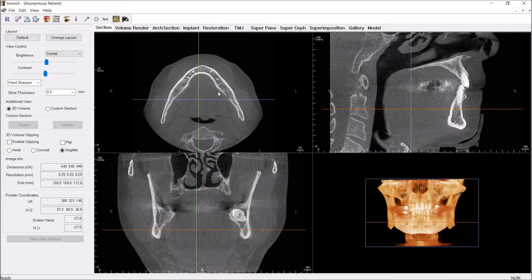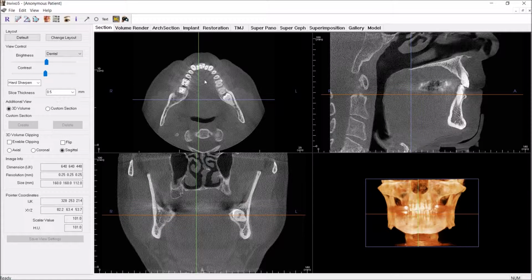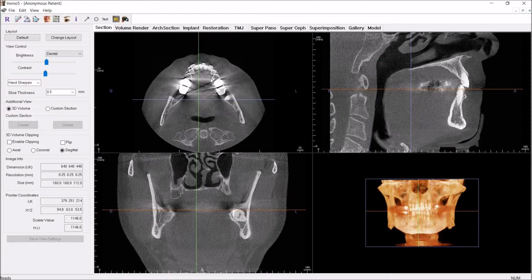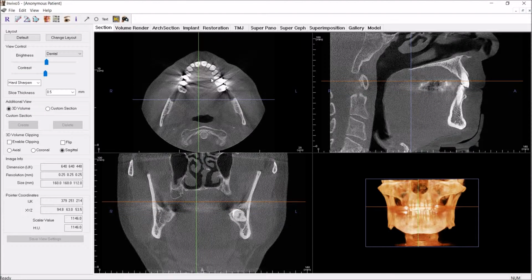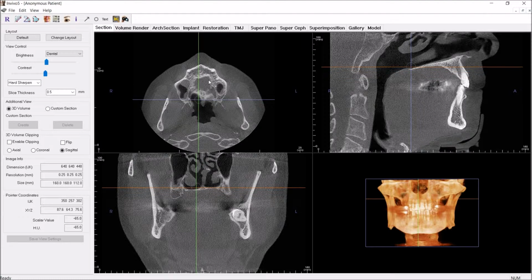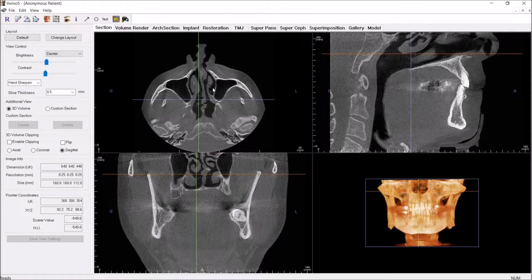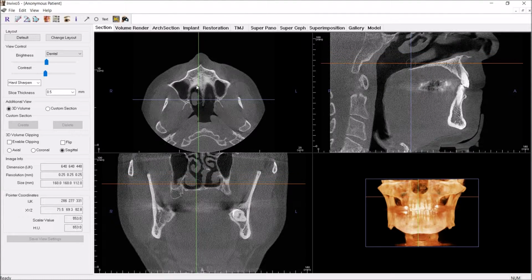That's important. You scroll up, we start to see the teeth in the mandible. Everything's symmetric. I don't see any root canals in these anterior teeth. Teeth are a little out of line, but of course we see that. Here I'm starting to get into the maxillary sinuses. Here I see the signs of mucosal thickening of the maxillary sinuses, and that's really common. You'll probably see that on most patients. This I might classify as a moderate thickening.